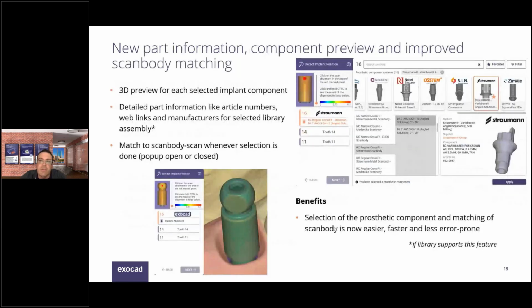So, another look at some options here. After you've selected a part, in the lower right corner of that selection dialog box there's actually a 3D preview of the part that we're using, and you can rotate that and zoom in, so you can see the actual mesh of the part that you're looking at to help identify if that's the correct library that you need for the case.